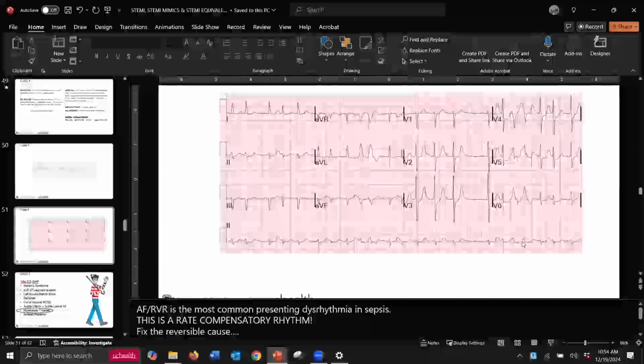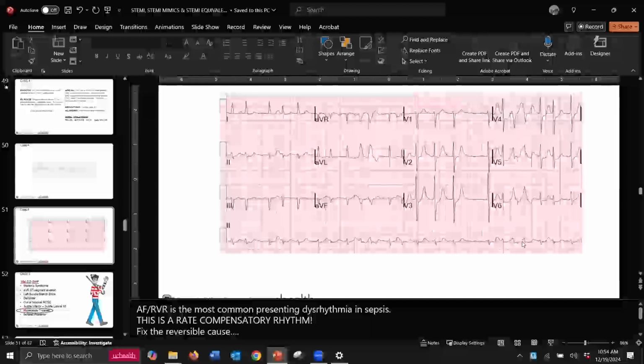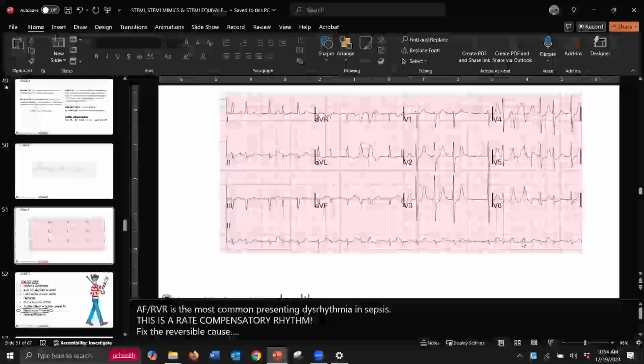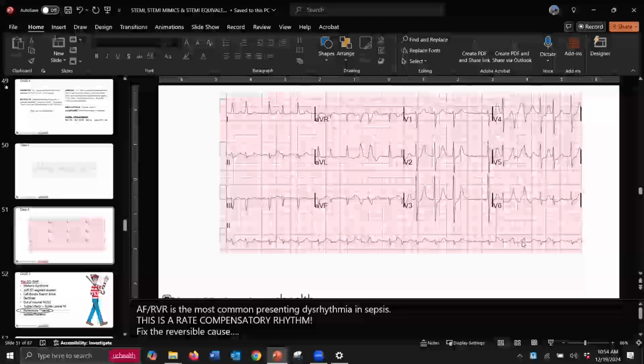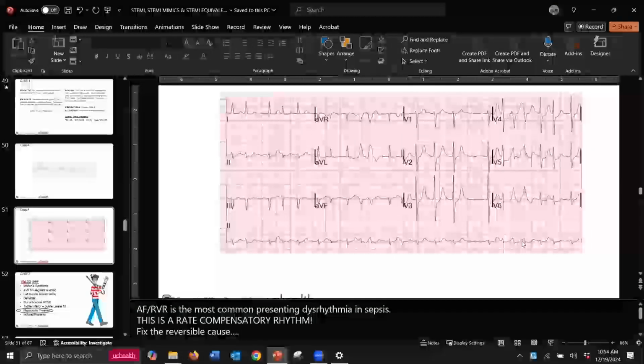There's some PVCs, there's compensatory pause. But are they PVCs or are they premature? The two that I am seeing, I would say, yeah. Well, what's his intrinsic rate? I'm seeing them in AVL, about halfway through it. Yeah, that rate would be tachycardic, but he already is tachycardic, right?